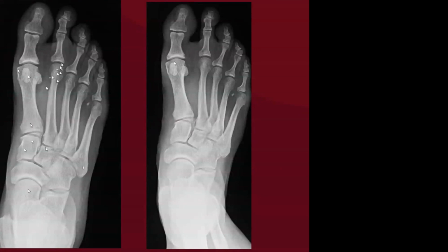Furthermore, we can see that the forefoot in this case is beginning to spread out where we have this overlap at the metatarsal bases, a situation that can be seen in metatarsus adductus or forefoot inversion. So inversion is where we're going to get the stacking of the metatarsals. So the additional second metatarsal stress can be seen here in this case by the cortical thickening.